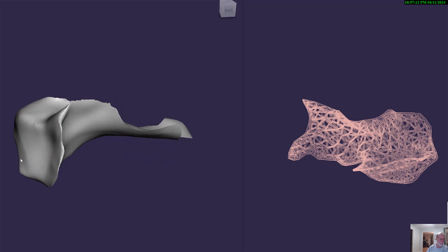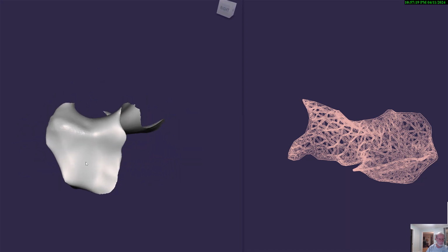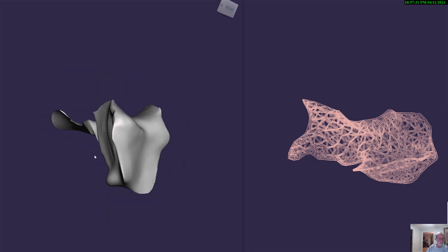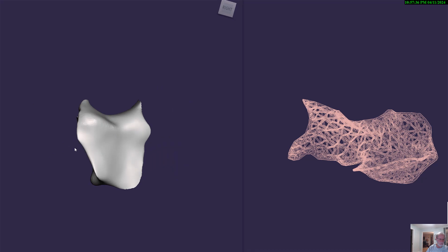This is the fill that is needed to get a full bone graft of a unilateral cleft palate. Obviously this part here is not necessary. So this is an STL file. It can be printed, but except for the volume, it doesn't give any advantage.